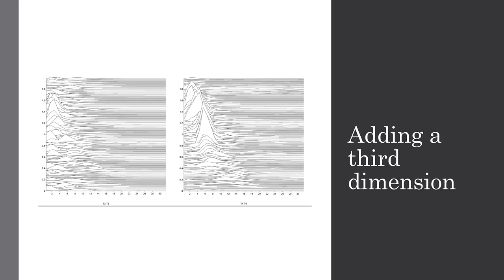And this is going back into the old days a bit, to what they called a hidden line CSA. This is laying it out in a pseudo three-dimensional way. We're looking at T3, T5 on the left, T4, T6 on the right. The higher the amplitude at the frequency being plotted, you'll see a line go up in that pseudo 3D dimension. The bottom scale is frequency, so we're going 0 to 30 hertz. And as we look at that vertical axis, this is going back in time. So you can think of these being added and then receding to the background.